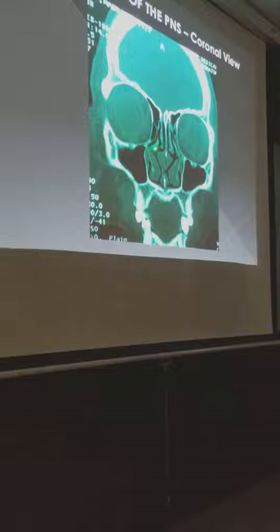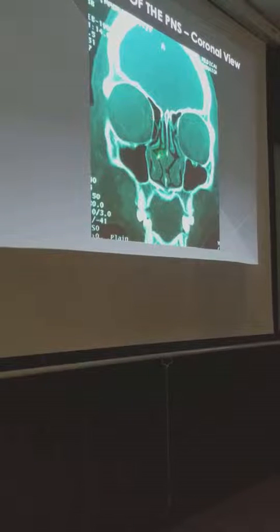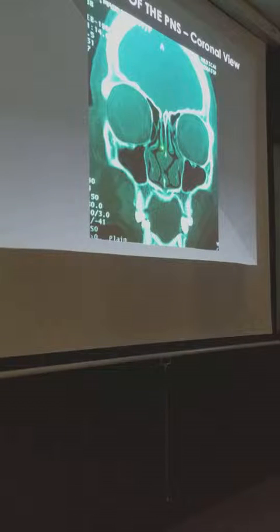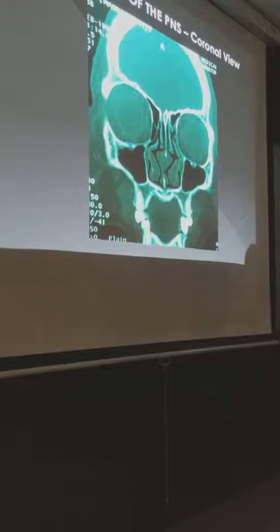Ganun din if the uncinate is attached to the middle turbinate, diretso sa infundibulum. But if it is attached to the lamina papyracea, then it drains now medial to the uncinate process into the meatus. Di ba? Hindi sa infundibulum.